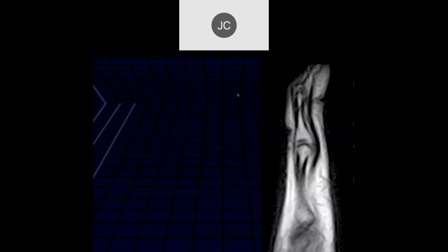Notice that there is flexion of the distal phalanx right there. And this is called a mallet deformity or a mallet finger, where you end up not healing properly, often because there's a bone injury involved, not just a tendon injury, and you end up with flexion of that distal interphalangeal joint. John, do you want to comment on this? Quite a few surgeons will use K-wires for this and a splint. Okay.